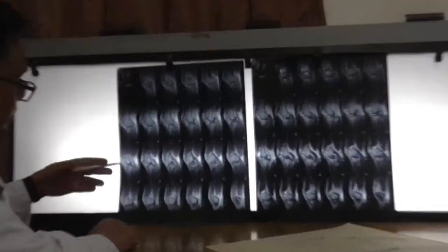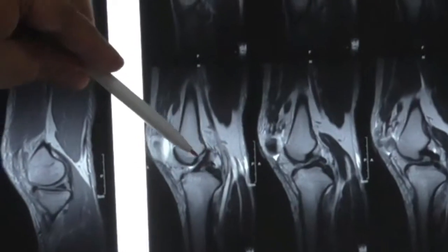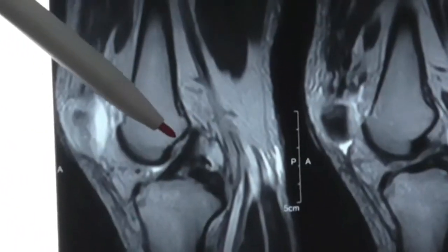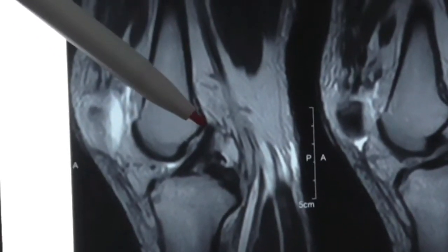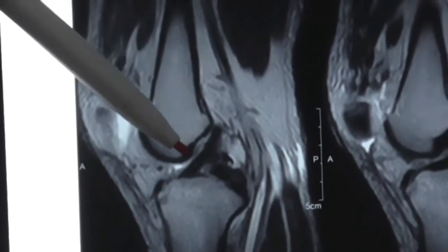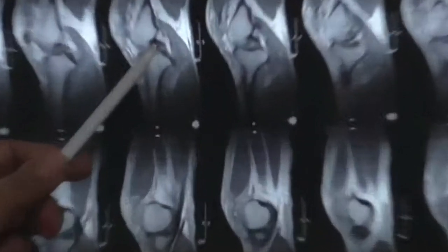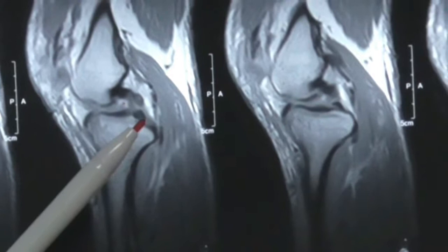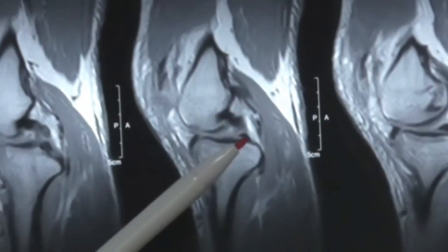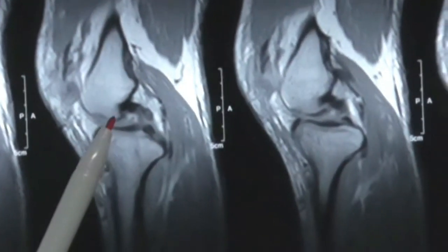Now a case in which you can see that the ACL is intact. This is the ACL of the patient, and the ACL is intact because if you draw the lines we were discussing, the Blumensaat line and the ACL line, this is closing into the femoral side. So this is an acute angle to the Blumensaat line. That means the ACL is intact. If you trace the PCL, you will find that the PCL is wavy, and there is a tear of the PCL. This is more visible in this one. Can you focus here, Vijendra? Yes, so this is the proximal part of the PCL, which is not continuous with the distal part. So this is a case of isolated PCL injury, which is very rare in these kinds of patients.